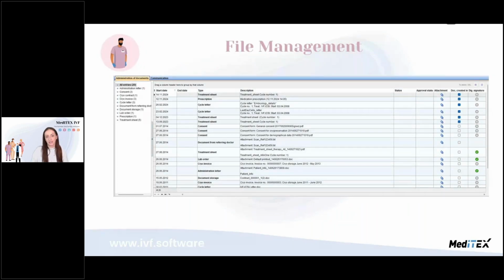If I select my patient and I go to the demographics of my patient, I can see all the documents linked to my patient. By the way, MedITEX IVF allows you to create documents from the system, such as cycle letters, treatment sheets, cryo invoices, of course with your clinic logo, and our team would help you configure it the way you need it. I can also filter these documents. If I search for a different type of document, I have easy access to the documents of my patient without losing anything, and everything in one place.